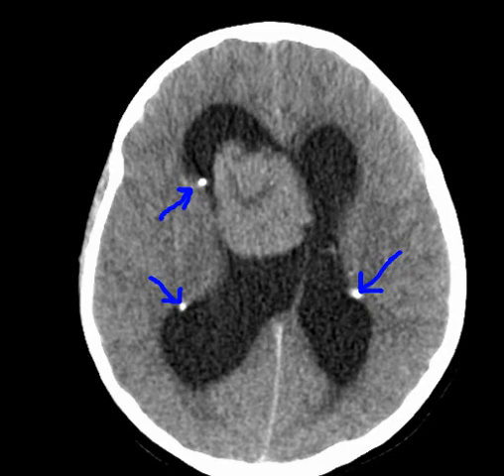So putting things together, this is a case of tuberous sclerosis with associated SEGA. SEGA stands for subependymal giant cell astrocytoma. Whenever you are shown a case of tuberous sclerosis, please first look at the history of mental retardation and seizures, associated skin findings in the face, and the imaging findings on the CT brain: subependymal hamartomas or calcified tubers at cortical, subcortical, as well as subependymal locations.